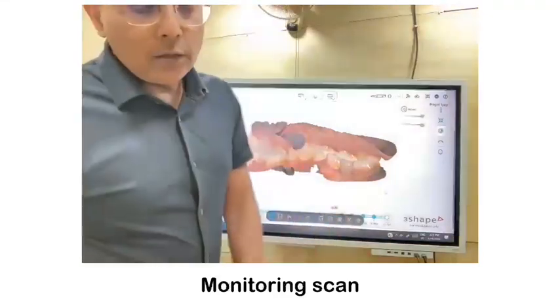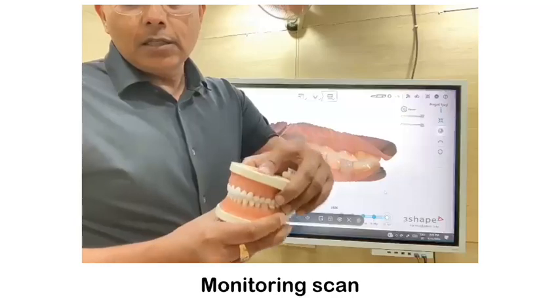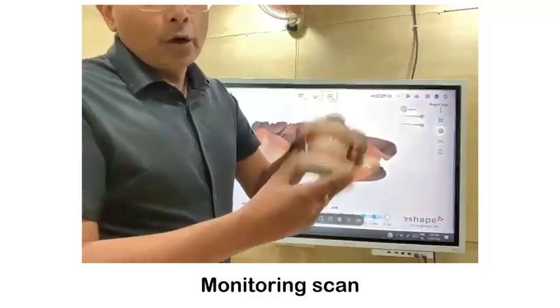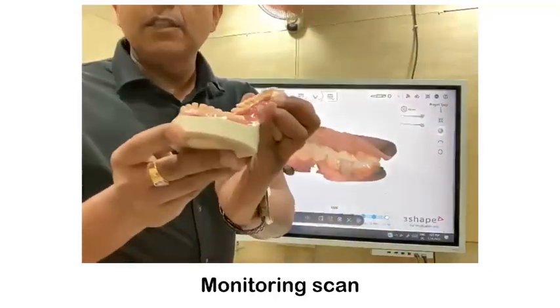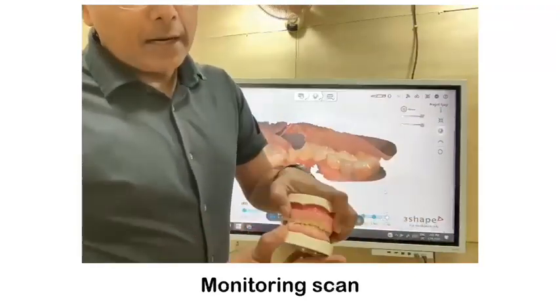Now we decided that this occlusion lock has to be created. This is the correct occlusion. This is a normal occlusion where there is less hit and slide. When you eat, there is slide, but occlusion locks are there. These are occlusion locks. The cusp tips and the canine tips create the occlusion lock. And when they wear off like this, see, when they wear off, the occlusion lock gets damaged, the canine guidance is lost.